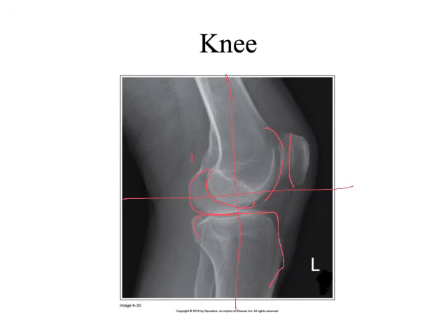The patella is going to be situated proximal to the patellar surface of the femur, and we want that patellofemoral joint open. Then the distal articulating surfaces of the medial and lateral femoral condyles are superimposed. That's what we just indicated with those little half moon shapes, right? And the knee joint is more or less in the center of the exposure field.